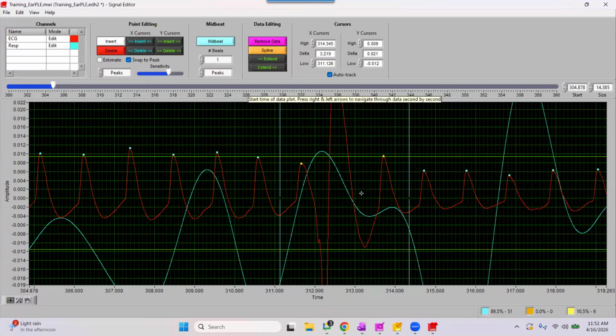Given this movement, where we don't have as good of a systolic peak to accurately score, I would instead place a mid beat here, which will be placed at that 0 amplitude line with this blue circle and a star icon around it, representing this estimated beat. So although we lost the pulsatile waveform there, or we weren't confident in where the true systolic peak is, we're able to correct this waveform and get both of our dots to turn blue, indicating that we've made a correct edit.